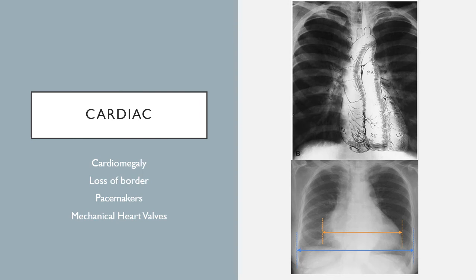If you showed up to anatomy, you'll remember that the heart is found in the chest, so let's start there. This diagram gives you an idea of the anatomical landmarks you'll be able to see. Starting on the patient's left side, the right side of the screen from the top, you'll see the arch of the aorta, the pulmonary artery, and the left ventricle.